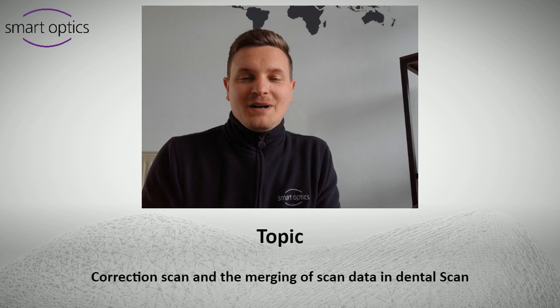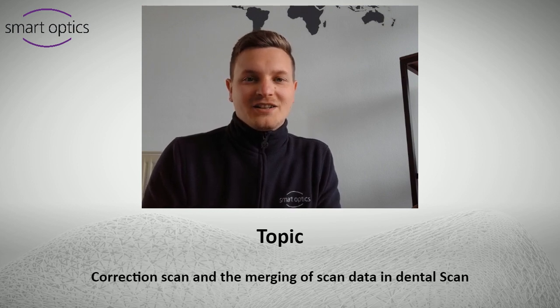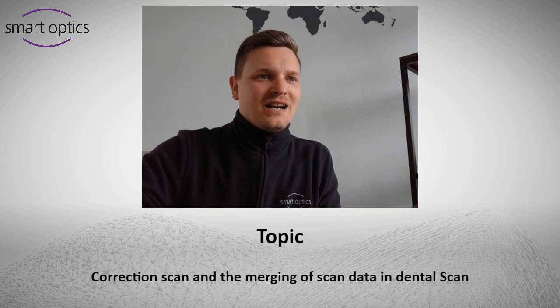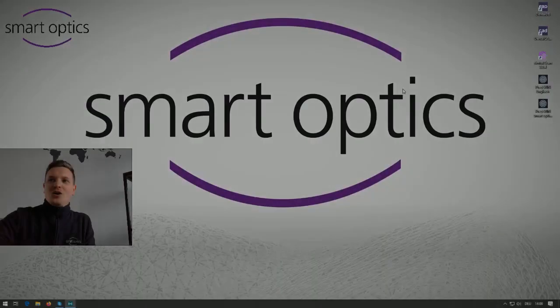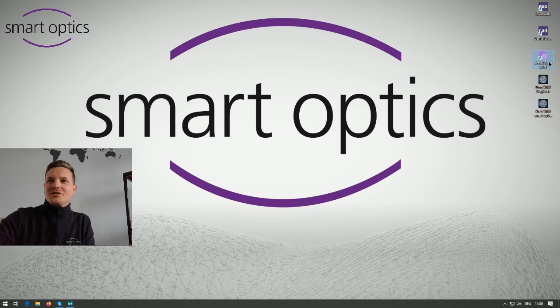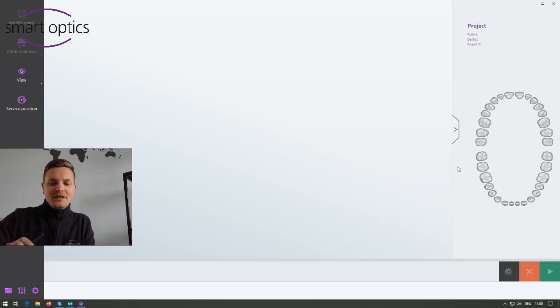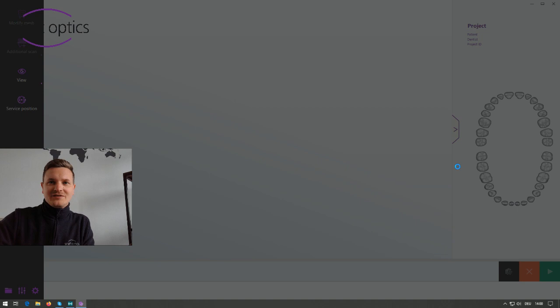Today's topic is about the correction scan and the combine mesh function, and I will directly start and open the dental scan software for you. During the scanning I will explain to you the differences between the correction scan and the combine mesh function itself.